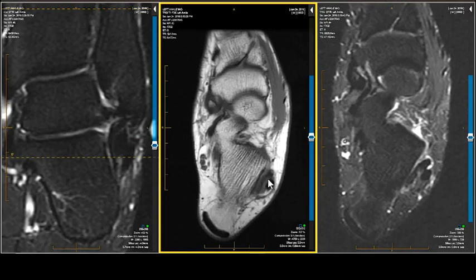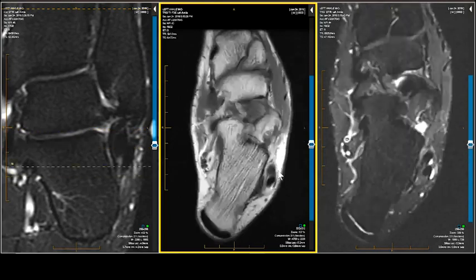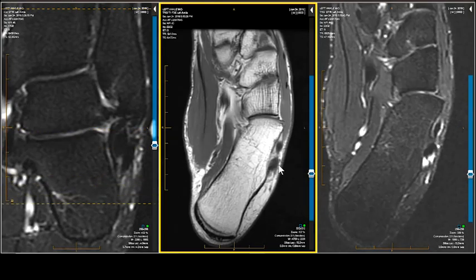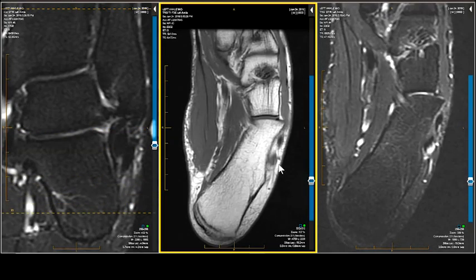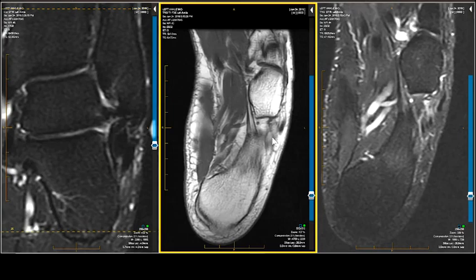Want to check for a peroneus longus or brevis tear. Nobody read it, but he's got it. Follow carefully. It splits. Now, that's not the usual tear that you see with the peroneus longus. Usually don't split, but this one did.